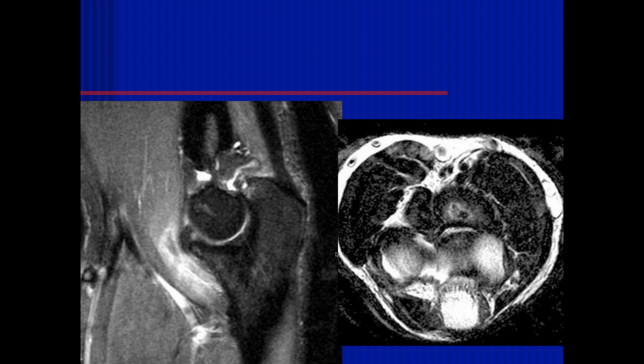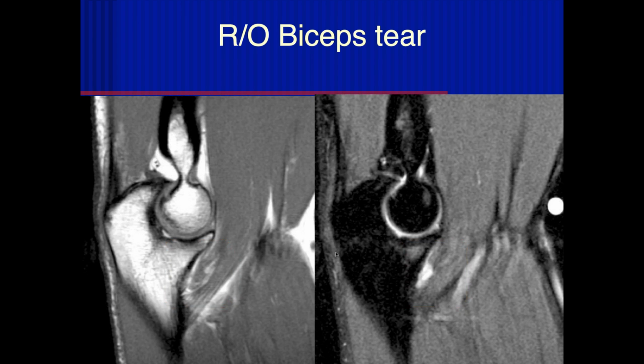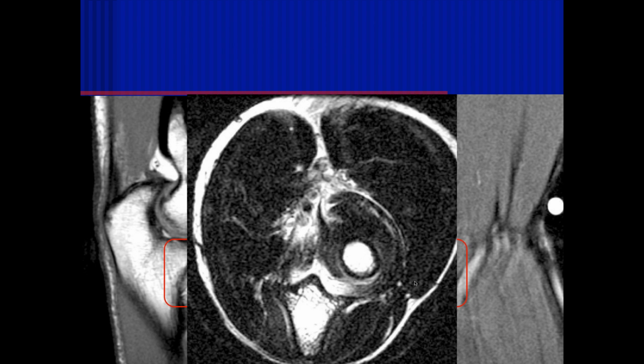Okay, Michael, here's another patient. John, is that because you can see the fluid more laterally? Well, here on the sagittal image, we can see whatever this is coming down and attaching to the ulna, not the radius, so it must be the brachialis. Yeah, right, that's for sure. But on this image, the axial one, yeah.